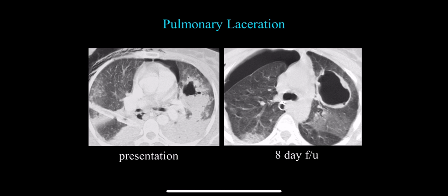This is the same patient at presentation. We see an air fluid level within this pulmonary laceration, a relatively thick wall. 8-day follow-up, we see decrease of contusion and more thinning of the wall of this large laceration.